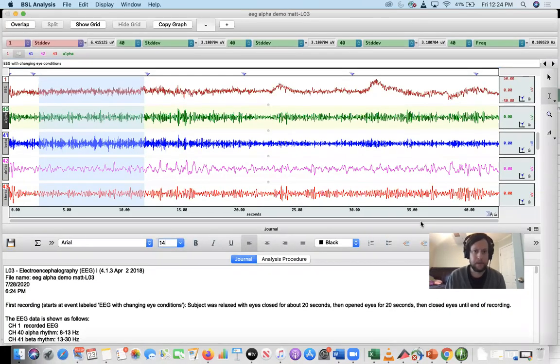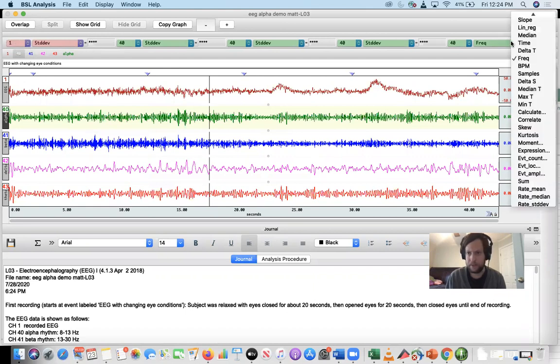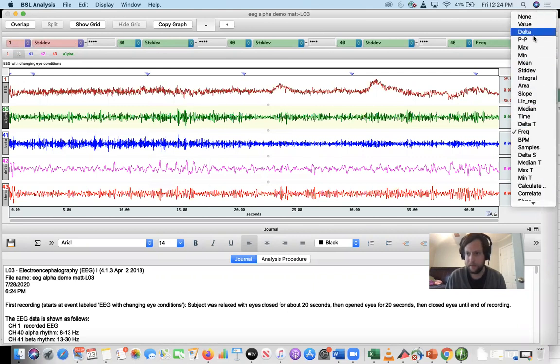And here's that one. I already have this one set up pretty similarly to the other. The channel 1 standard deviation measure right there, and then I have 40 measurements over here. I'll change this one to standard deviation again. Where was that?